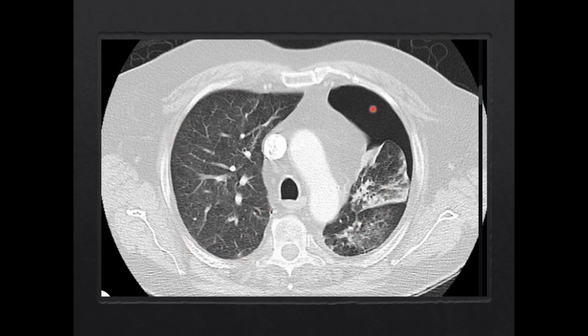On this side, however, we see this enormous black spot where we do not have lung markings, and we see this denser area where honestly the lung has just collapsed in on itself, creating much more dense tissue in these areas. This is the pneumothorax.